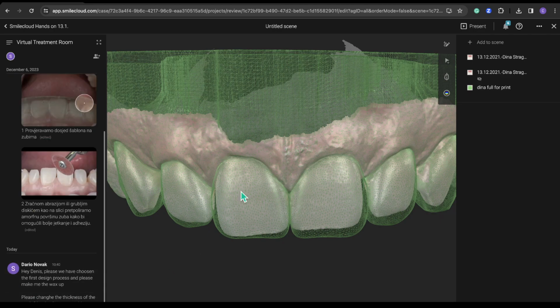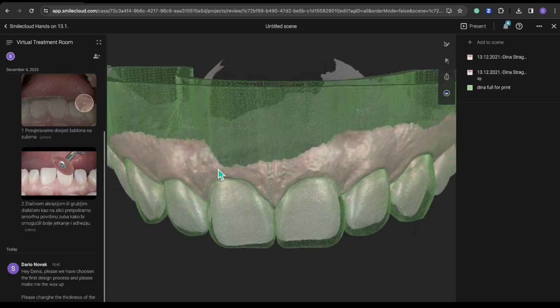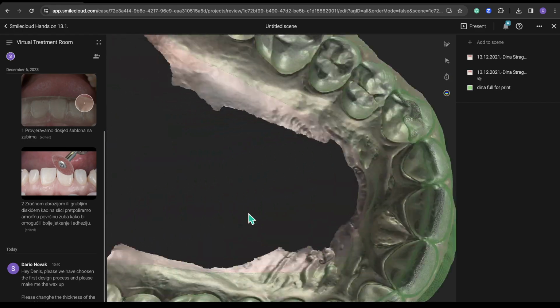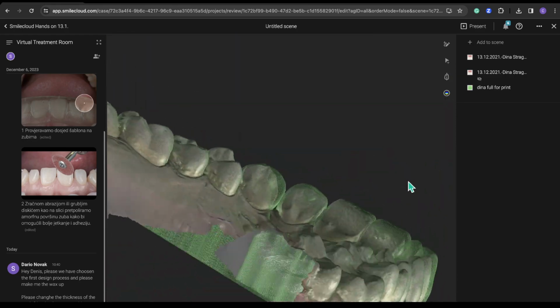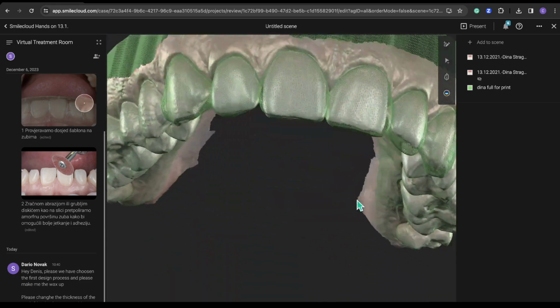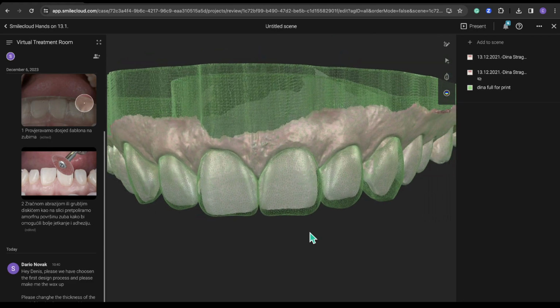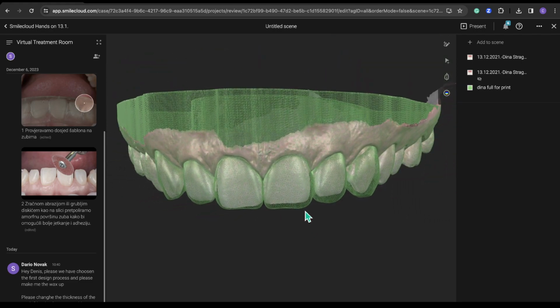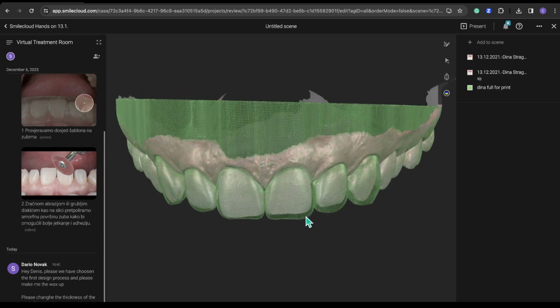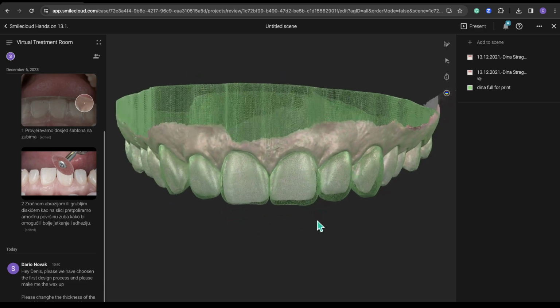And now he can do the reviews before you even see the patient, and you can create your perfect design right here, even before you start with the next step, which is calling the patient into the office, which actually saves you a lot of time with doing a mock-up which might not be good. Just to be sure, you can postpone it until you're sure in your review mode that you like everything you have seen in this case.